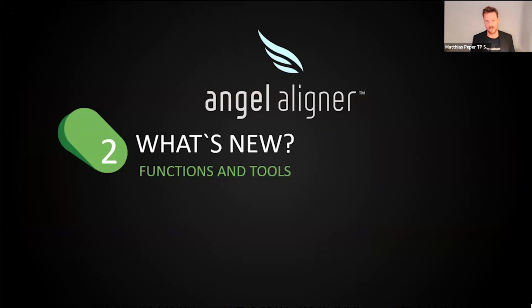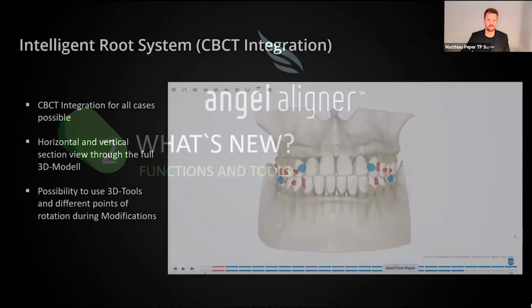What's new? Functions and tools. We have seen that Angel Aligner has so many new innovations that we really like. And today I will explain a little bit the newest functions and tools from Angel Aligner, how we use them, and what is the best way.